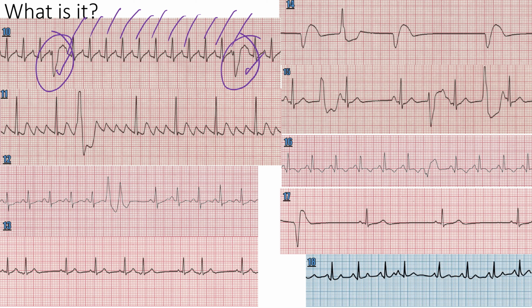There's definitely a fast rhythm, so it's sinus tach. Well, is it sinus tach? Well, I don't really see P waves, so it might be SVT, right? It's a really fast rhythm. It came from the atria because it's narrow, so it's SVT with PVCs. Yeah, paroxysmal SVT with unifocal PVCs.